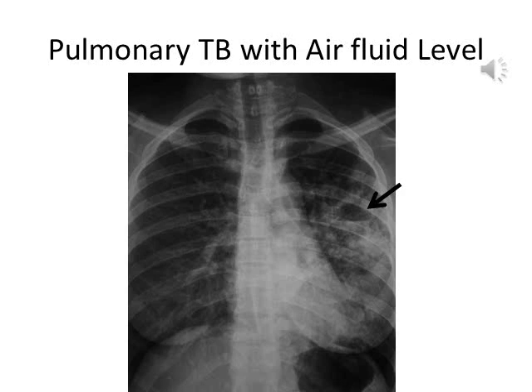This X-ray shows what happens when a cavity is filled with fluid, which is usually pus. Again, this feature could be caused by other causes of lung abscesses and not just TB. And sometimes lung cancers also present with a similar air fluid level picture on chest X-ray.